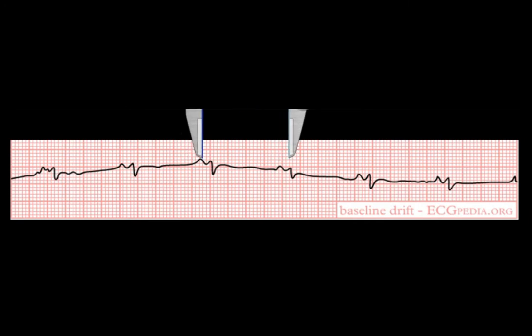Okay, so let's go ahead and organize these. And I have to really judge where things are at. I can't get to a great baseline. So when I move this, you can see that it's tough to tell whether or not this is actually regular. So it becomes a little bit more difficult. Again, if it is something you absolutely need to do, you could potentially use it, but I would say go ahead and hit the print again.